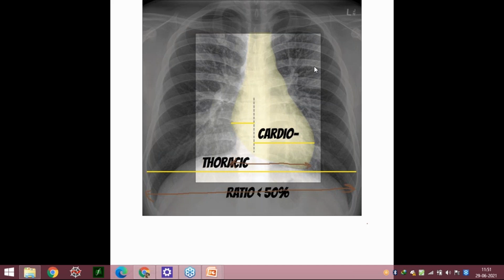So that is what I'm saying. In elderly, usually what happens is that there is calcification of the arterial walls, and the arch of aorta can be visible on the chest X-ray itself. Now, anyhow, that is an abnormality. Yeah, Monckeberg calcification is one of the types of calcification that would be there. That's good. So we'll be seeing the arch of aorta. We'll be seeing the normal pulmonary trunk is concave. This is the pulmonary trunk. Then the left appendage, you can say left atria is usually not visible. It's the left auricle or the left appendage, and then left ventricle.